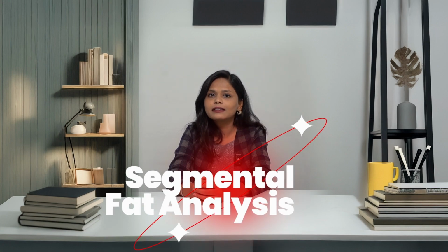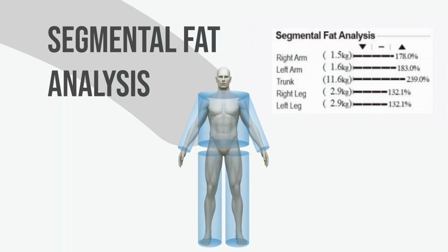Similar to the segmental lean analysis, you can also find segmental fat analysis on the result sheet. Similarly, where exactly how much amount of fat is accumulated can be targeted, and accordingly a little bit more exercise focus can be given to that region. If there is more fat accumulation in the trunk, then core exercises can again be beneficial. If there is more fat in the upper body, fat burning exercises. And similarly, for lower body, a little bit of exercise modification can be very beneficial.